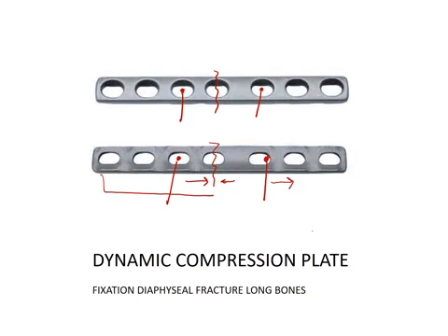In dynamic compression plating, you put a screw in the center, and on the other side you put an eccentric screw, so that it slides the bone and plate, causing compression at the fracture side. Now, dynamic compression plate provides this dynamic compression at the time when you're fixing it. It is not something which is dynamic throughout, like a dynamic screw where the dynamicity is when the bone is uniting. Subsequently, what we realized in a dynamic compression plate is that when you were fixing it you were exposing the entire bone, so there was compromise in the vascularity.